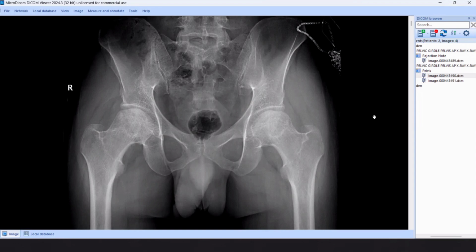That's good. As you said, we have here a frontal radiograph of the pelvis and both hip joints. And I think it's not only on the right side. It's more evident on the right side. We have a geographic patchy area of sclerosis at both sides. Also we have some lucencies inside this sclerotic area, and also a sclerotic margin here, a serpiginous line. Do you agree with me?